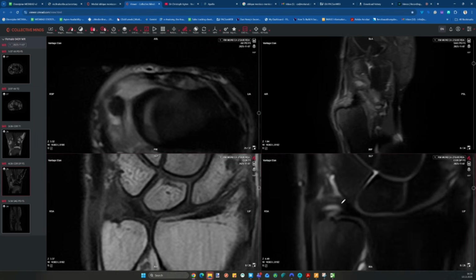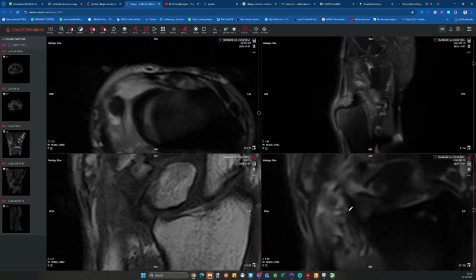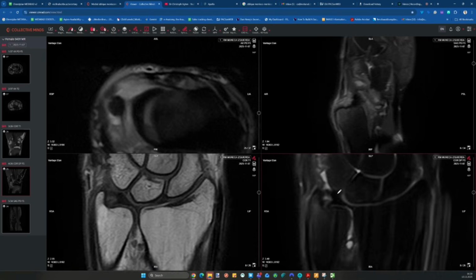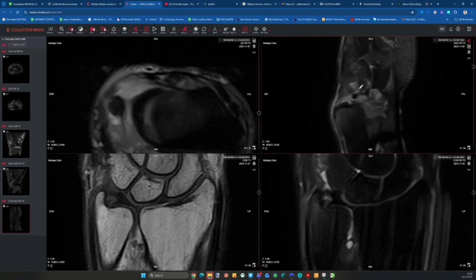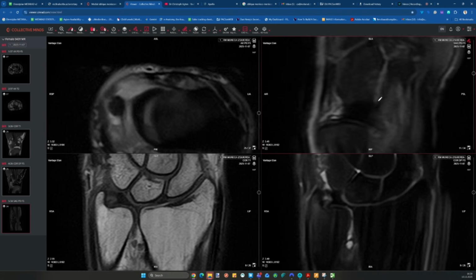But yes, I think there is definitely a sprain of the dorsal radioulnar ligament or dorsal peripheral TFCC attachment, no central perforation. I don't see a distinct tear. If we were to give contrast into the distal radioulnar joint, I think it would stay contained. Potentially, the question is what happens if we give contrast into the radiocarpal compartment? Would it go in between here, which would maybe make the styloid attachment partially torn? But I think this one's covered.